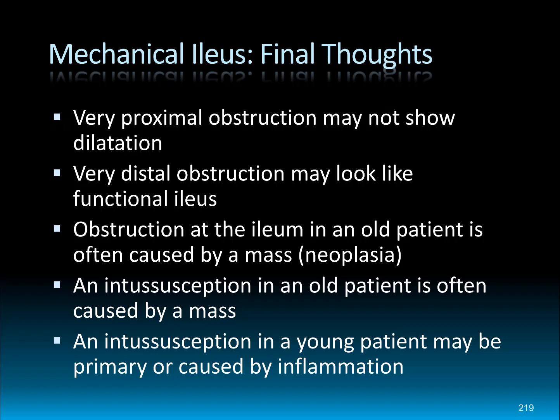So just because there's an intussusception doesn't mean it's the only thing there, and you always have to consider other potential causes for it. And that will take us to the end of the obstructive talks. Next up is functional ileus.